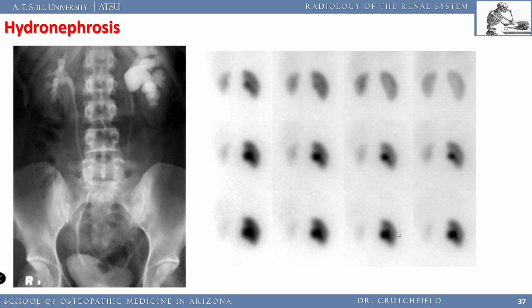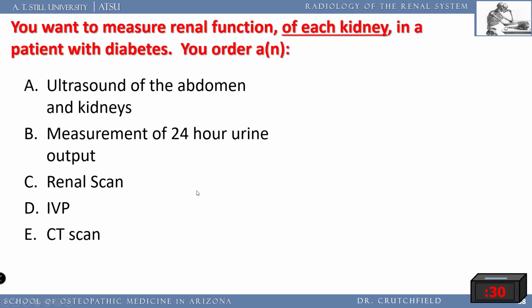So we get a two-way problem here. The blood flow in looks good, but the blood flow out is not very good. And also the drainage from that hydronephrosis area, from that renal medulla down into the ureter, the urine draining is blocked. So we've got poor outflow, poor venous flow, and we also have something blocking the actual output of the kidney itself.